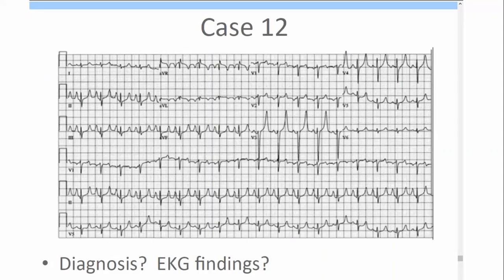What do you see? Looks pretty fast. My first thought kind of goes to, whoa, look at this. We're supposed to look at that anyway, so I'm glad. It's pretty tall, isn't it? I think my eyes kind of go over here. What the heck is this?